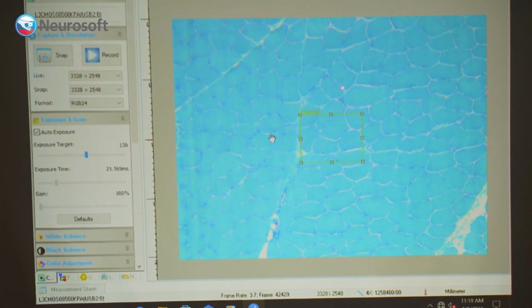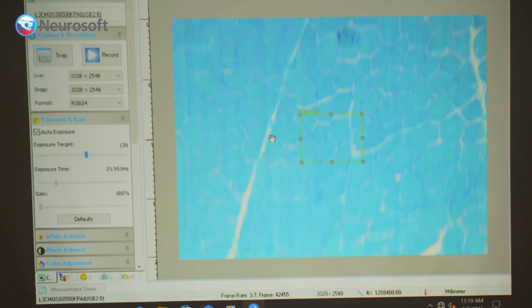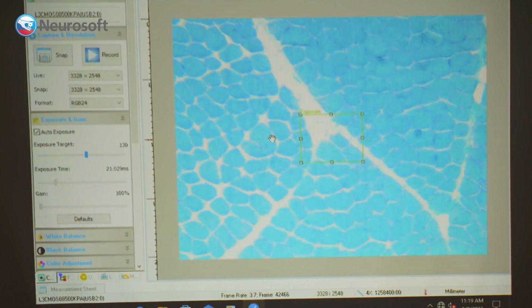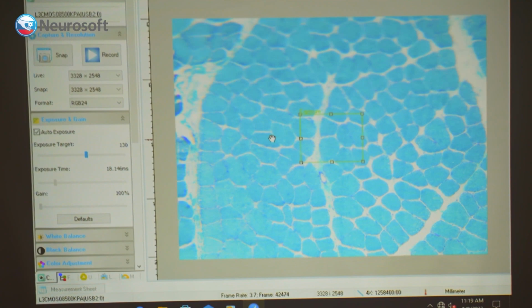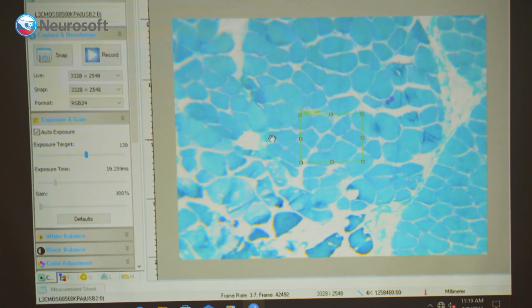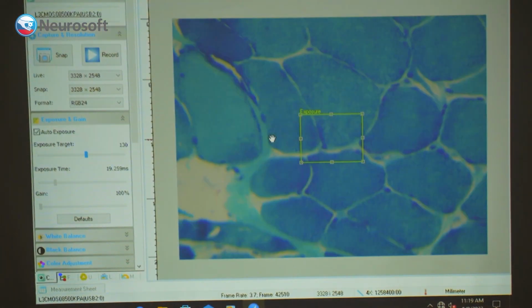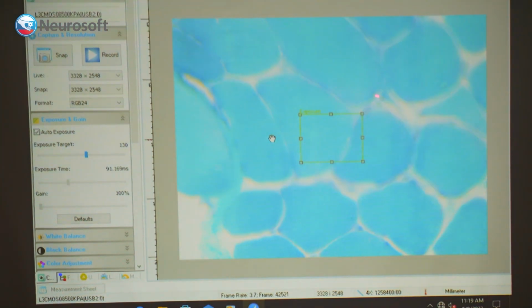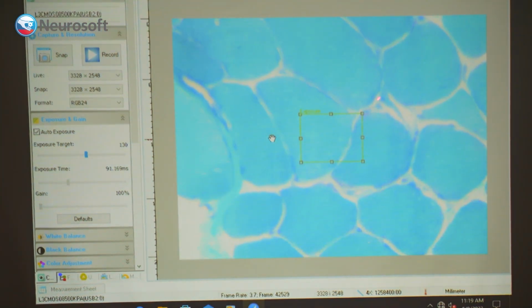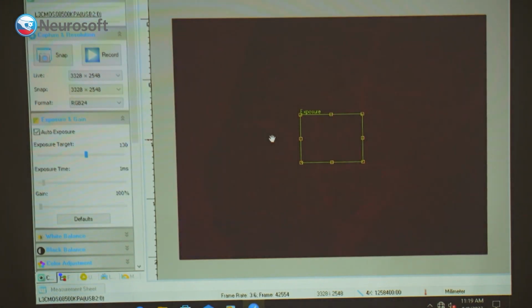Yeah, so from time to time, you see this type of small angular fiber, atrophic fibers. But they are not really clustered. So I don't think we can tell this is neurogenic, but it can be neurogenic. Here as well, you can see small angular fiber. Maybe this is minimal group atrophy, but I don't think this is definitive.